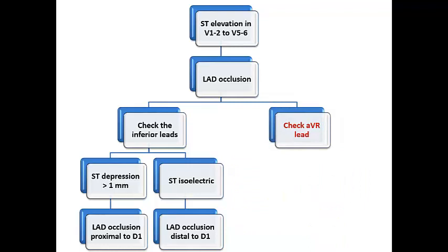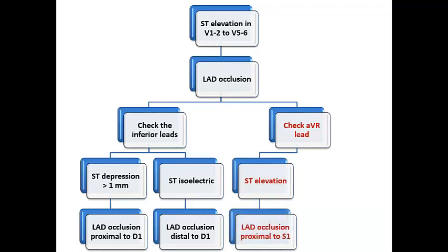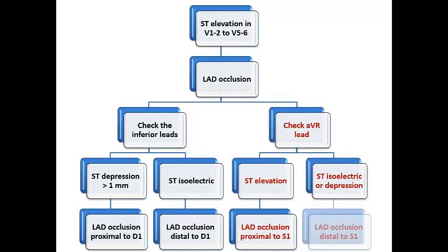I can also check aVR. If there is ST elevation in aVR, so also the injury vector is directed upward toward it due to extensive infarction. So I can expect that LAD occlusion is proximal to S1 with involvement of the basal septum. And if ST segment is isoelectric or depressed, so LAD occlusion is mostly distal to S1.